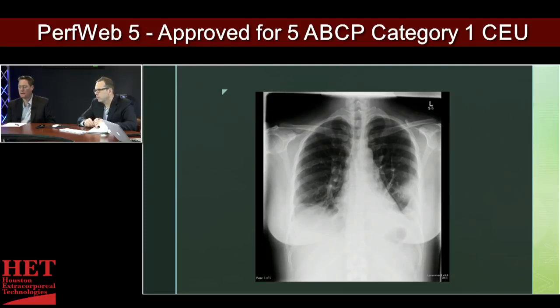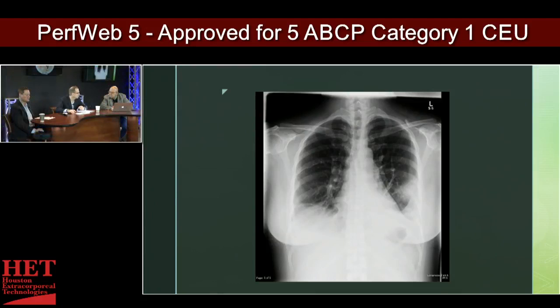And then you get the non-perfusion of that area of the lung, so it gets congested, full of fluid, and that's why you start to see it as a bright white spot. And so that's just a malperfused portion of the lung consistent with the pulmonary embolus. We usually don't see x-rays like this much anymore just because they're picked up so early with CT scans. They come in with shortness of breath in the emergency room. It's almost always straight to CT scan. And so they're often starting to be treated before an x-ray shows a defect. The defect doesn't show up immediately all the time with chest x-rays.